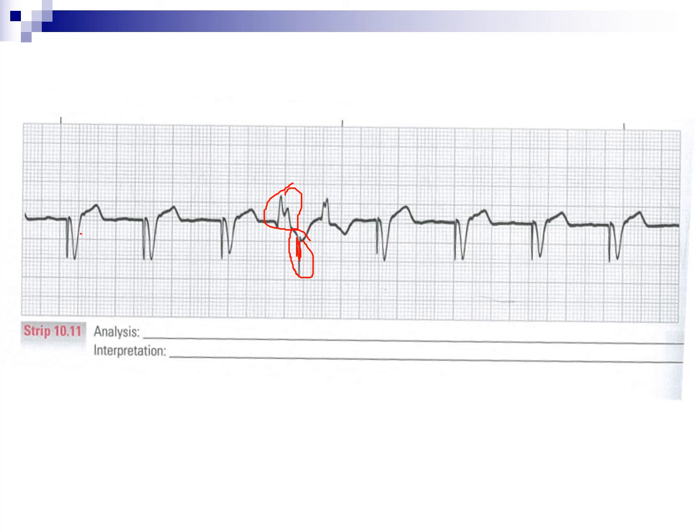So this is failing to sense the patient's own beat, or you can say it's undersensing. So when you have a pacer spike too close to the patient's own beat, then we would say it's failing to sense. So it did not sense that beat.